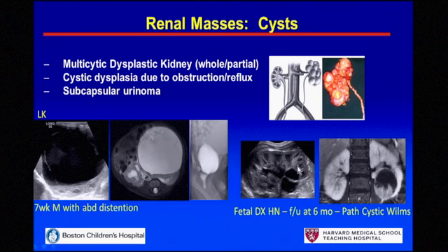The example on your right is a very interesting case where a patient initially presented as a fetus with the observation of what was called atypical hydronephrosis.